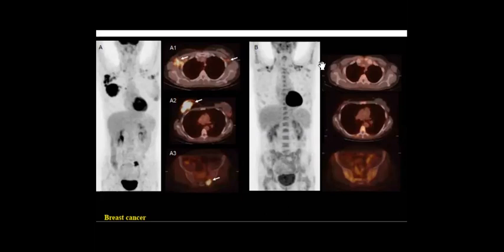Perfect. Then when this patient did follow-up, this is the second follow-up after he took treatment. Chemo and, yeah. So what happened is regression. You can see that the sacral lesion shows regression, and the lymphadenopathy and the right breast lesion.